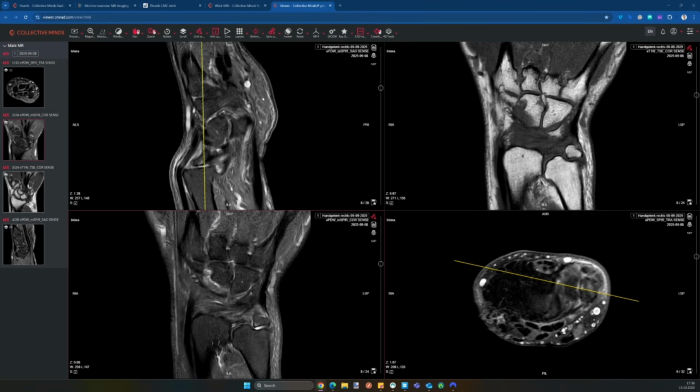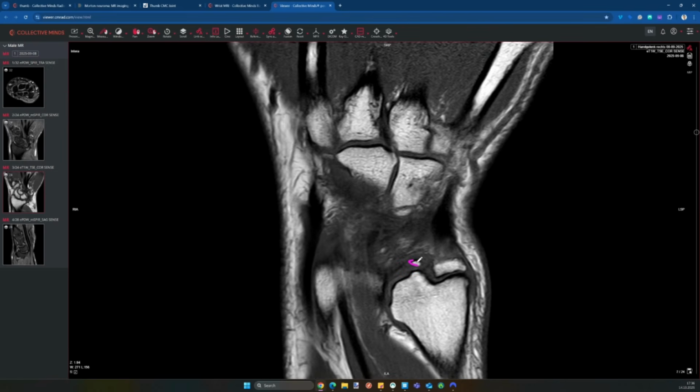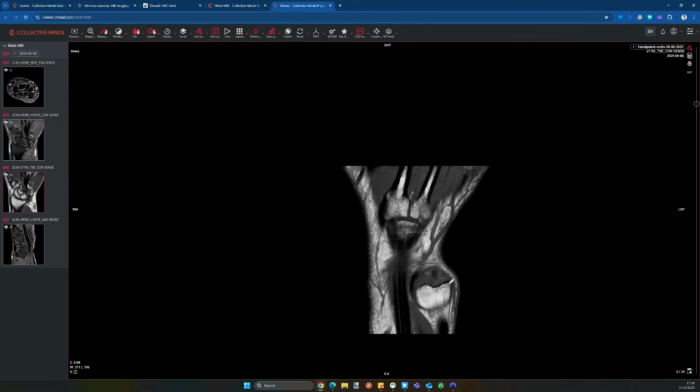We got the wrist MRI here in a 40-year-old man. He had an old trauma, no recent injury. And I mean, the obvious finding would be the pseudarthrosis here after an old fracture. There may be smaller ossicles close by. And the head looks quite big.